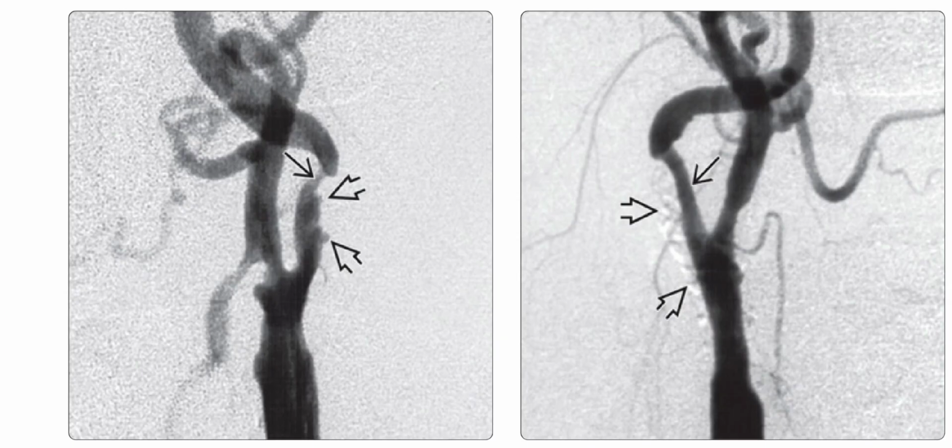Left image is the lateral angiography in a patient with left hemisphere TIAs, and it shows a high-grade stenosis distal to the left ICA bulb. Multiple irregularities in the atherosclerotic plaque are seen here as outpouchings of contrast. Irregularity is an independent risk factor for thromboembolic stroke, making this an at-risk plaque. Right image is the lateral angiography in the same patient, and it shows the long segment stenosis of the right internal carotid artery origin. Also note the subtraction artifact from dense wall calcification.